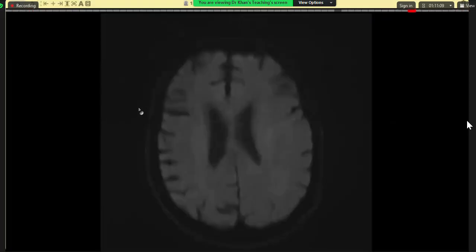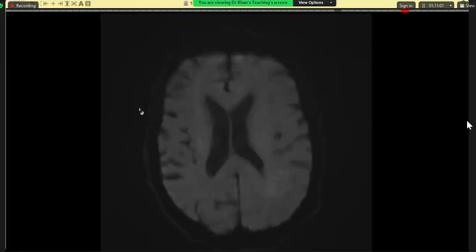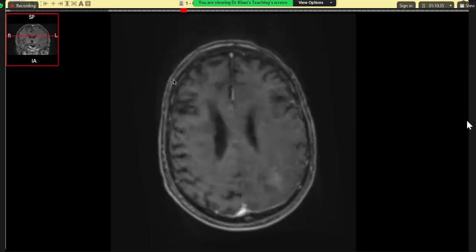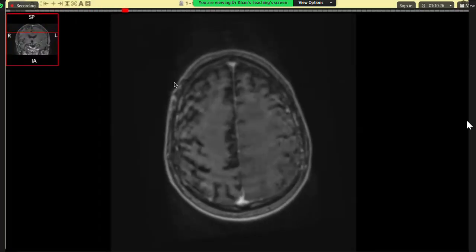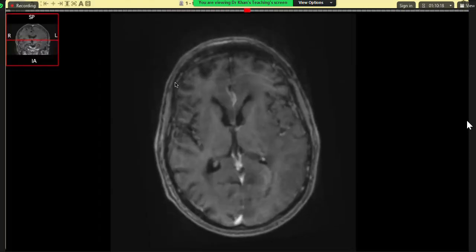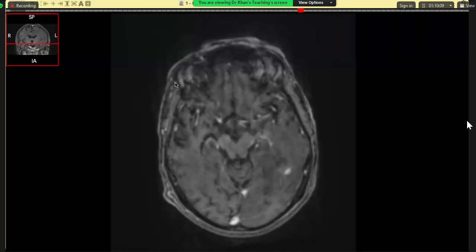So this patient coming with new onset confusion. So there are multiple hyperintense signals in T2 and in FLAIR and non-restricted diffusion lesions. Can I see if there is any contrast enhancement for this? This is the contrast, and the patient moved a lot, but I am scrolling for you. I can see that there is contrast enhancement, and it's multiple.